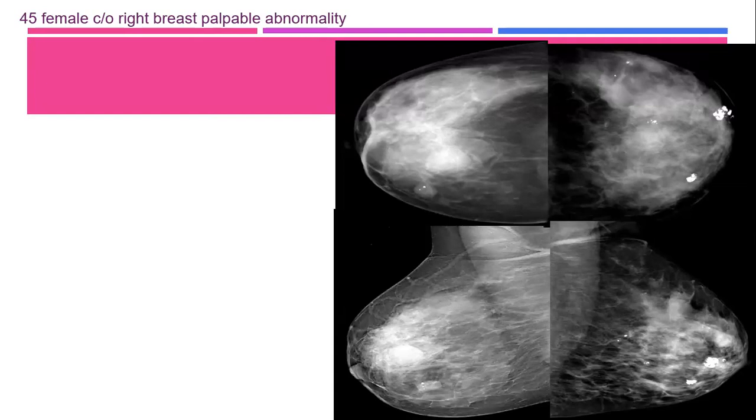This also is one of our patients who had missed breast cancer. What do you expect? The cancer in which side? And why is it being missed? This 45-year-old has a right palpable abnormality, a retroareolar mass. You see, she has bilateral, multiple, some calcified, some non-calcified lesions. So expected, okay, to be bilateral, multiple fibroadenomas.